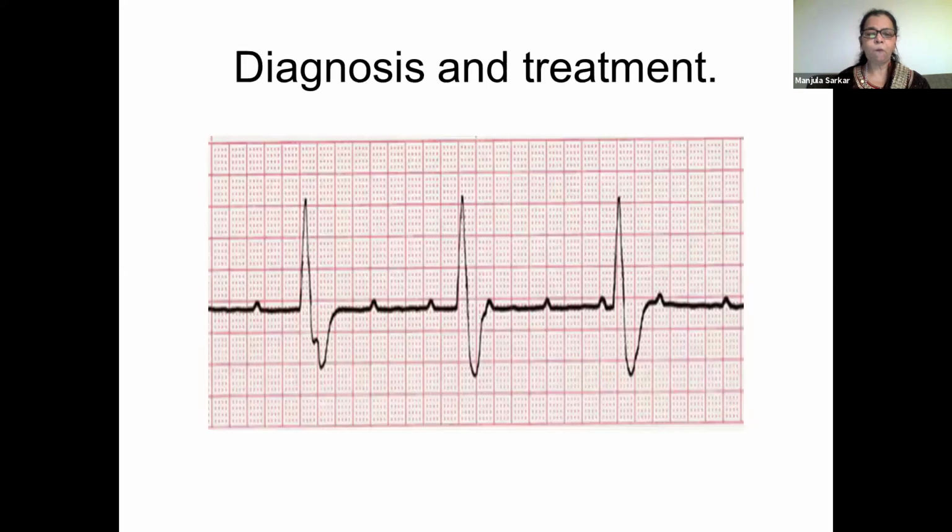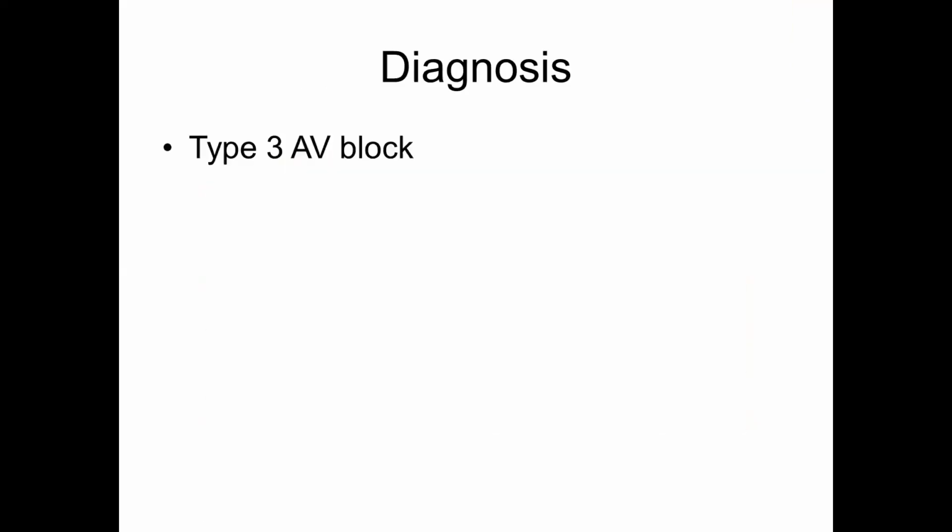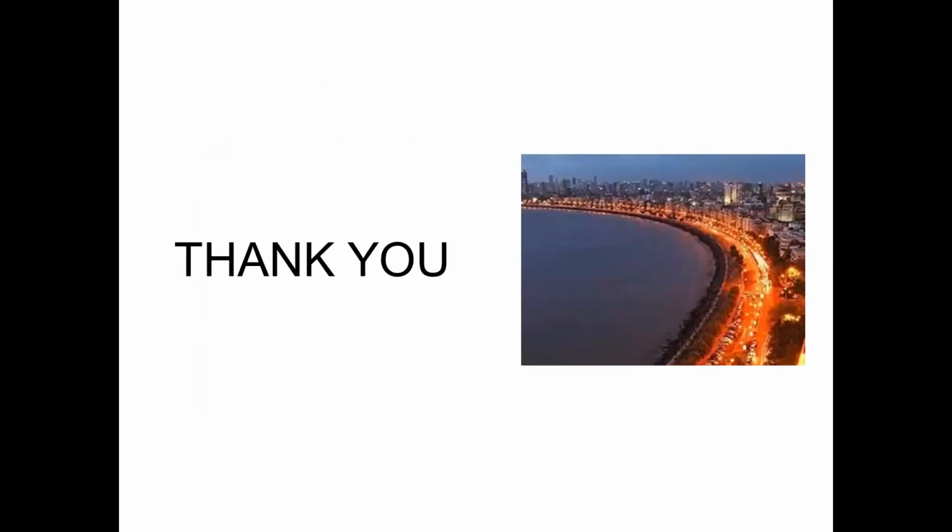Now this is complete heart block. So these are the few ECG tips which I wanted to tell you, and you should be able to diagnose them if you know the conduction system well, and you should know the causes and treatment of all these cardiac problems. If you want to know anything from me, you are most welcome to ask.